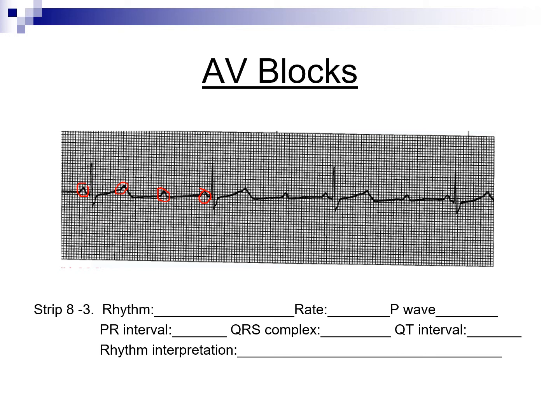The PRI, now we're looking at the PRIs where there is a P before a QRS, and they actually are constant, and they are pretty much 0.14 to 0.16, but they are considered constant, the same. Your QRSs are 0.10 to 0.12, and your QT intervals, if you're measuring from the beginning of the QRS to the end of the T, that is 0.68.